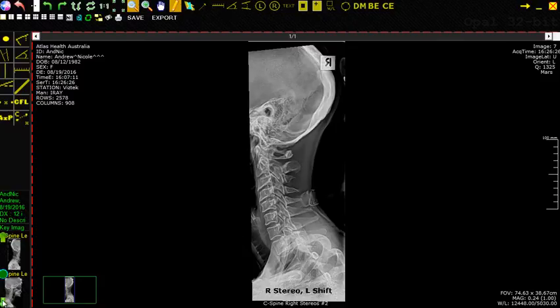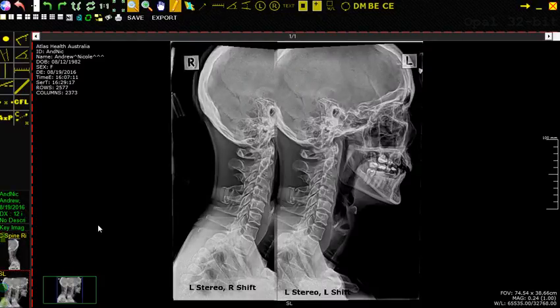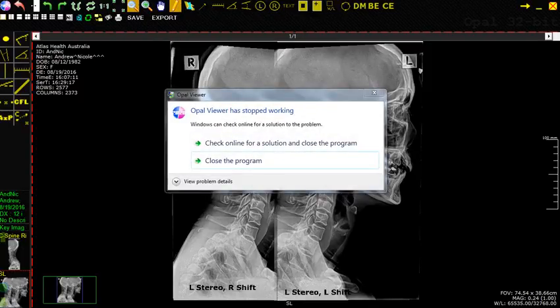But what it'll do is it'll stitch the images together. And what it does is it creates, as I said, one DICOM picture that looks exactly like this. And with this picture now, you can zoom in as a, whoops, uh-oh, it froze.